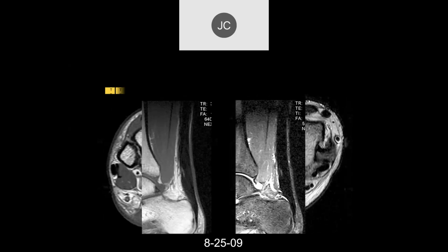And this, a year later, is a typical healing pattern that we've seen in tendons and ligaments, where you come back with a thickened tendon. Now, typically at this stage, the tendon is not as strong as the initial tendon was. The cross-sectional area is greater, but the fibers are not as strong. They're not collinear like type 1 collagen fibers are supposed to be.